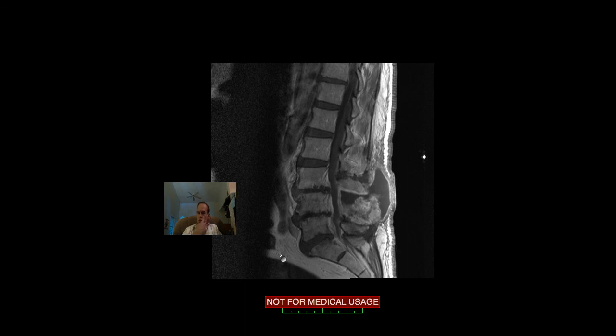And here's as good a picture as you can get of this being the defect of the partial laminectomy that was done at the L4 level, where fluid accumulated and subsequently communicated with the subcutaneous space here where the surgical incision had been performed and the laminectomy performed in the same procedure here, and you have what turns out to be pus communicating between these two compartments.